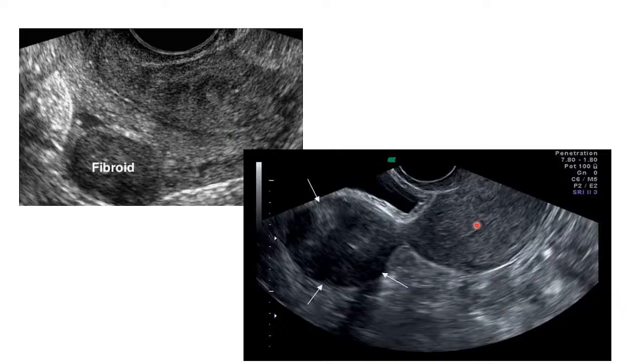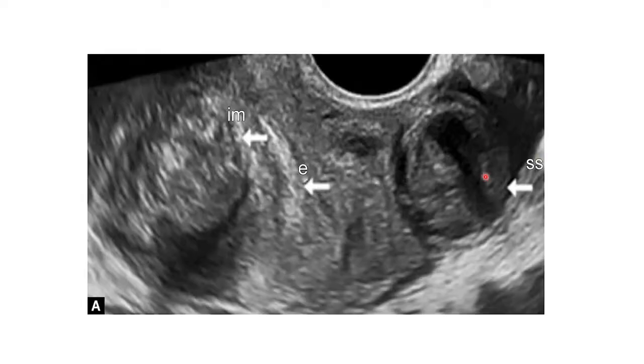So here we have a fibroid that is attached to the rest of the uterus by a stalk again. So I've spoken about this. This is what is called a pedunculated fibroid. It's held by a stalk. So that's a pedunculated fibroid. So again, here you can see this is another fibroid. So this is another fibroid there. So you can see all of that is a fibroid.